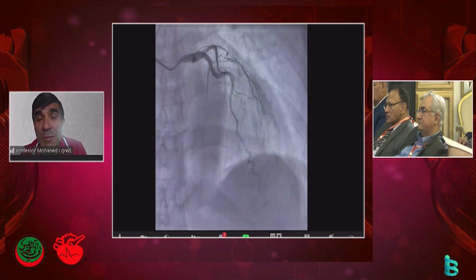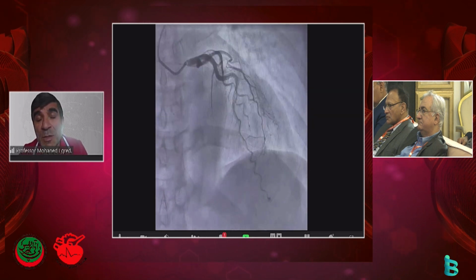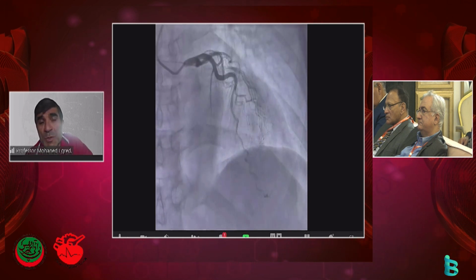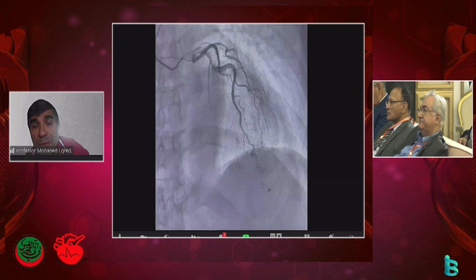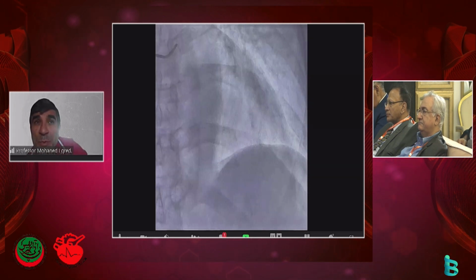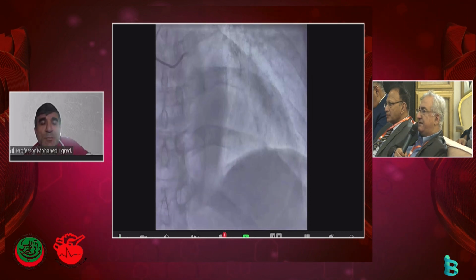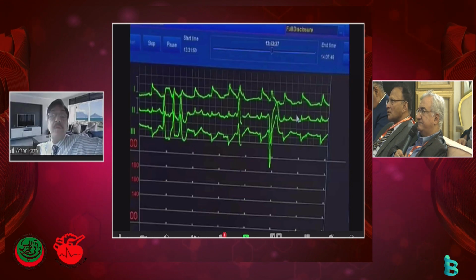And he moved the catheter, and the lady crashed. Got in with a micro catheter, and the left main was completely closed. With nitrate, it opened up without any issue. But air is always a possibility. Although, if you look at the images, that was the appearance even from the beginning. Can we see the first few images again, Afsar? Yeah, sure. Maybe they will suggest something.